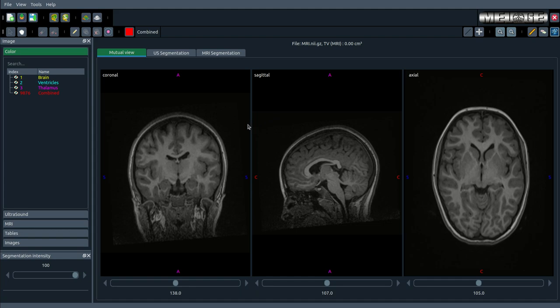To save this project, you can either click on Save from File, Save, or Save As in the toolbar, or click Save from here. That will quickly save your progress under the current project file name. If you choose Save As, you can specify a new file name and location for your project, which is useful for creating a backup or a new version of your current project.